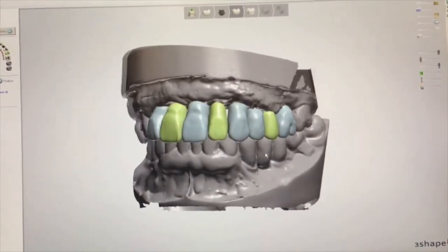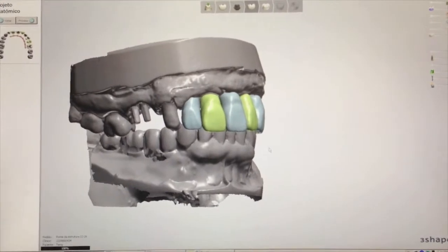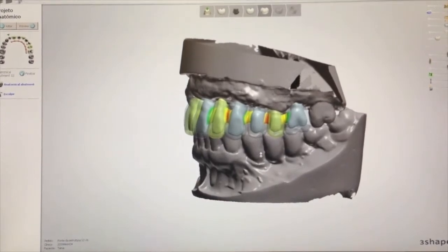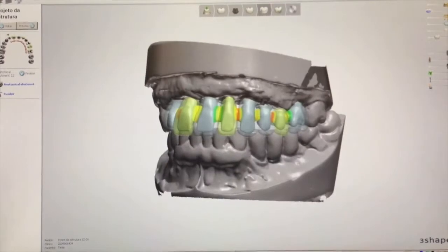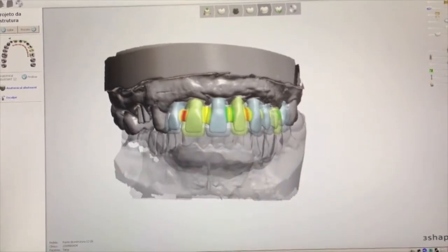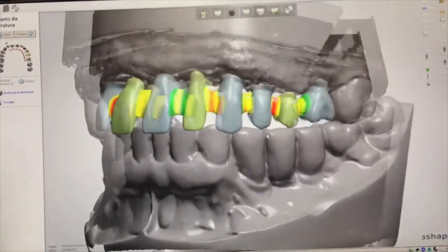On the teeth of the scanned model are superimposed the virtual teeth, in green for the pontics and blue for pillars. They are connected in a unique piece, and a command is given to be reduced to the equivalent space for ceramics. The contour of the teeth remains in transparency.